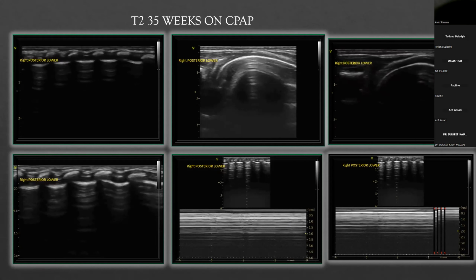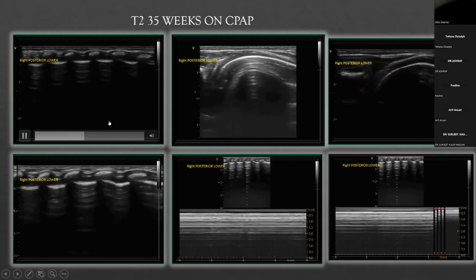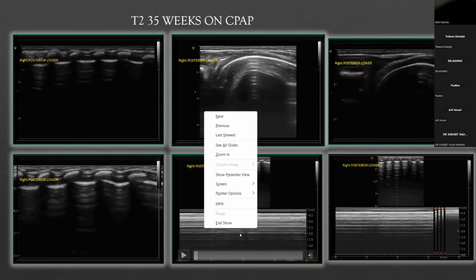But what you're seeing is basically A-line artifacts. Your harmonics are on. But again, if you could enlarge that image, I'd be so grateful. Are you able to enlarge the image, the one with the barcode sign? No problems. So I'll just highlight on this.